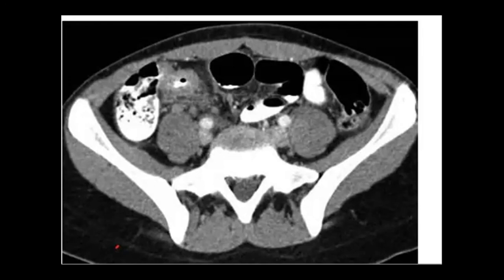They like you to mention for the FRCR that you make an urgent referral to gastroenterology and discuss with them the possibility of Crohn's. And probably you would like to see other CT or MRIs to check for the other imaging criteria.